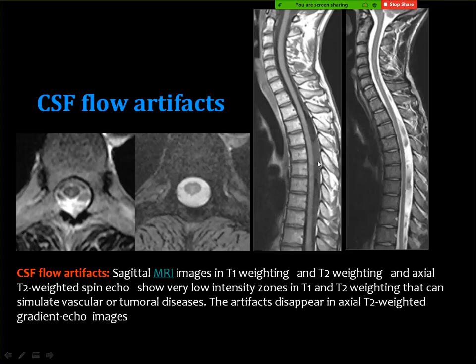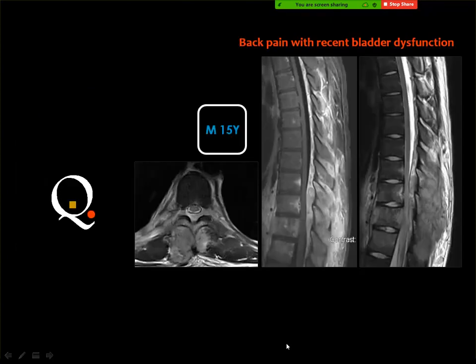They can be seen in the T1 and also in the T2 weighted image, but they are clearly identified in the T2 weighted image. Sometimes, if you change the pulse sequence, these artifacts will disappear. But many times I see that these patients were mistakenly interpreted as dural vascular malformation, and they are recommended for contrast studies and so on. But these are artifacts.